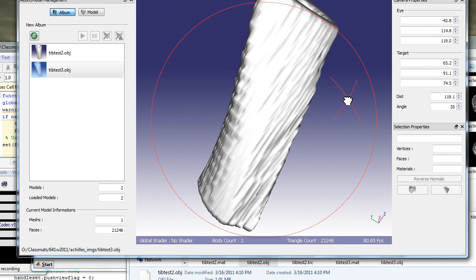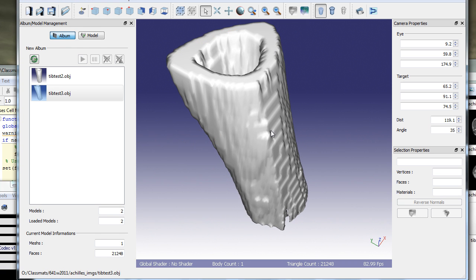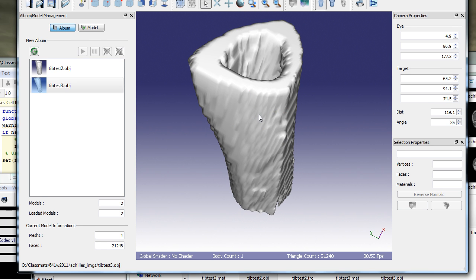All right. One thing you can clearly see though is how jagged it is. The next term, when we really start working on these reconstructions, we're going to see how to remove all of these artifacts. Okay, that's about it for this tutorial. So you should be able to do your reconstructions from here on.